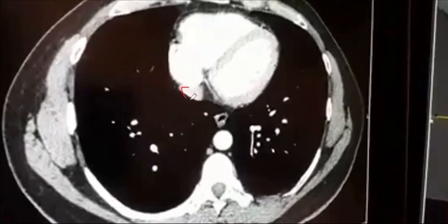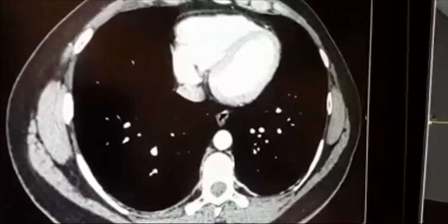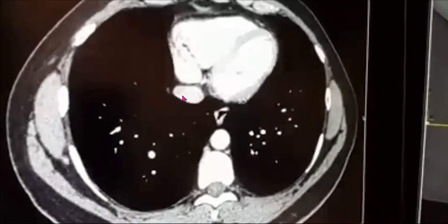So this part you can see is inferior vena cava. So this is again esophagus. This is descending aorta. This is azygos vein. So let us proceed. So you can see inferior vena cava completely clearly over here, and the structures are the same.